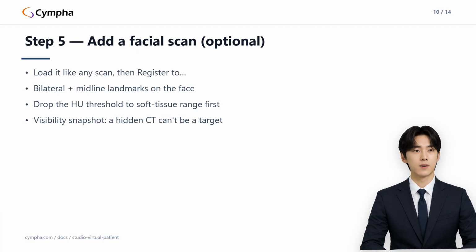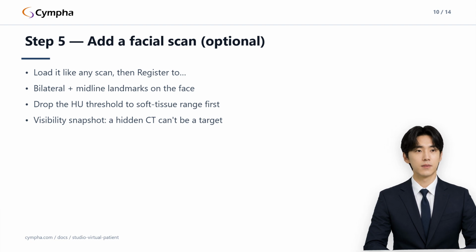It saves the current viewer layout as a single image, including the slice panes when the CBCT layout is active, prompts for an optional comment, and stamps the file name with the time. The capture drops into the same gallery, right beside the photos you added.